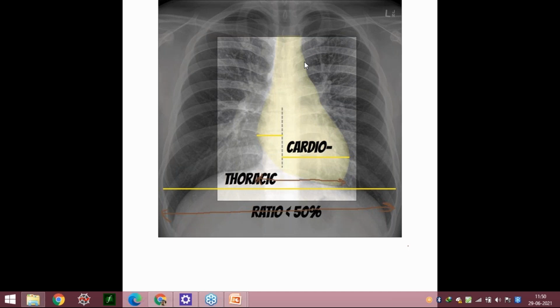No, not coarctation. No, not TGA. Arch of aorta, if I am asking, it would be visible on X-ray. Aneurysm may or may not be. Elderly, yes. In elderly, what is the condition that will lead to the visibility of arch of aorta? Atherosclerosis, you're getting close. What I'm saying is, if you just apply the basic knowledge of radiology, for anything to be visible on X-ray, it has to contain calcium. Yes, calcified media, calcification, exactly.